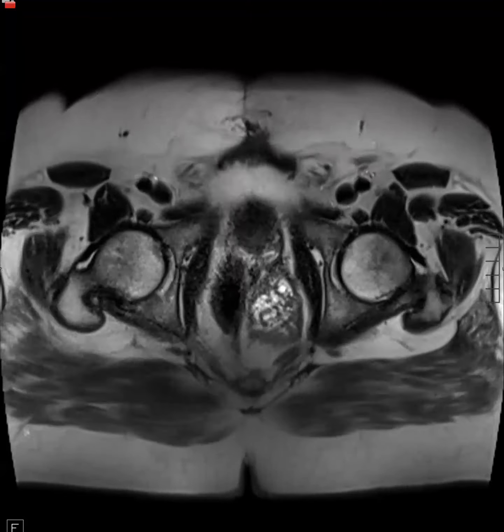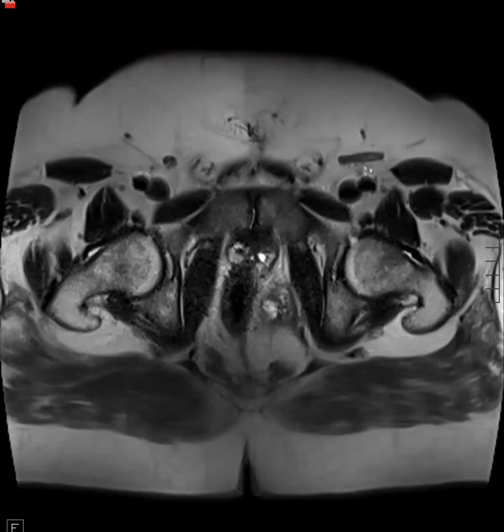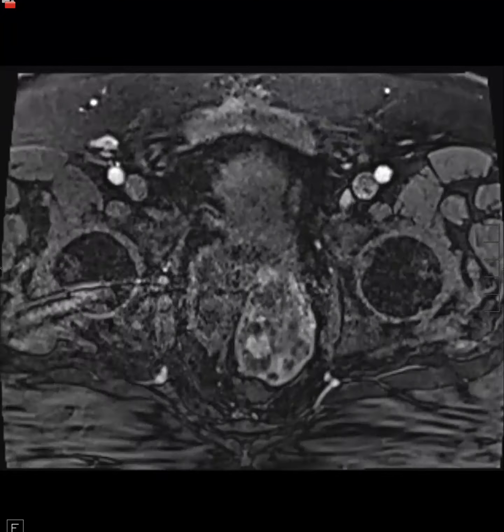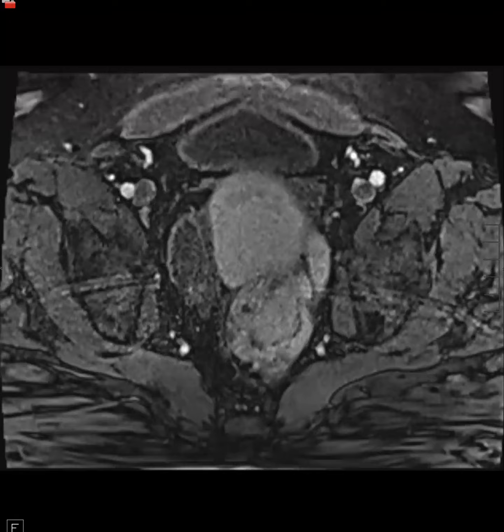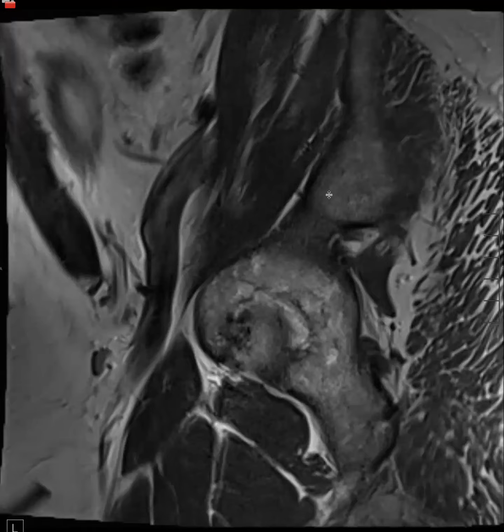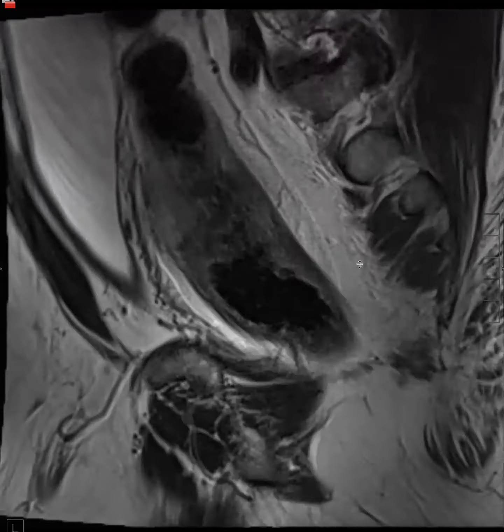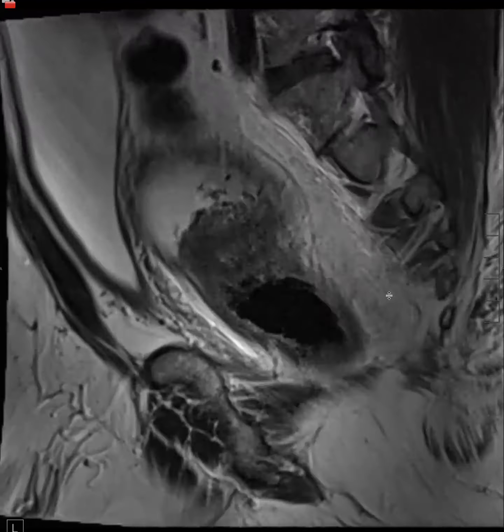Yeah, it does look separate. And then post contrast is here. That's a really good post, 60 seconds, but here's the prostate, and then the mass is here. It's moderately enhancing. I'm sure the top part is blood, hyperintense on T1, and it has mass effect on the posterior bladder wall.